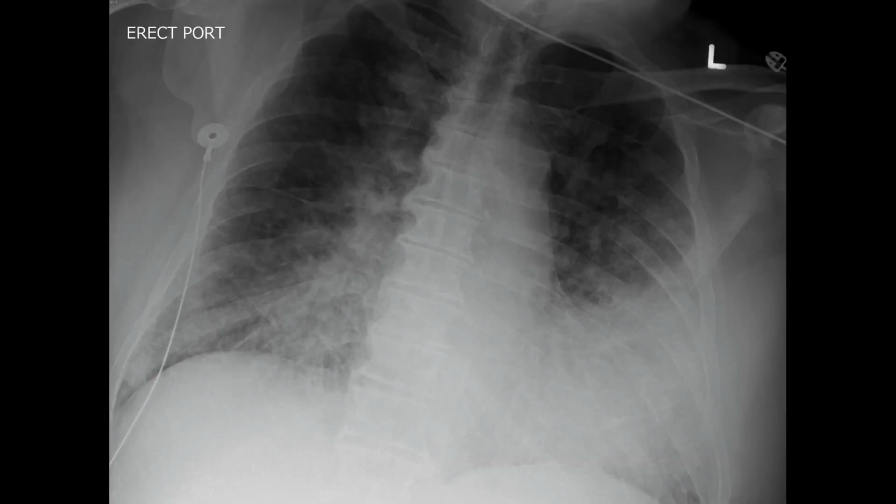We get a patient that has a chest x-ray that looks a lot like this, right? And so we see, it's obviously rotated and tilted, but a lot of pulmonary edema in this patient. And so this one's a pretty easy one. I think we all had the answer really at the starting slide, but this is a patient who basically has flash pulmonary edema.